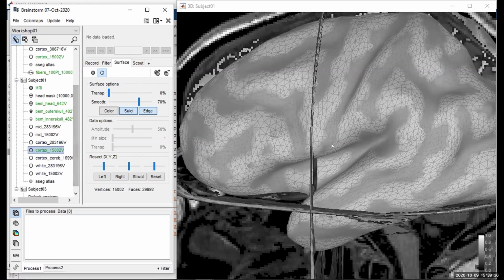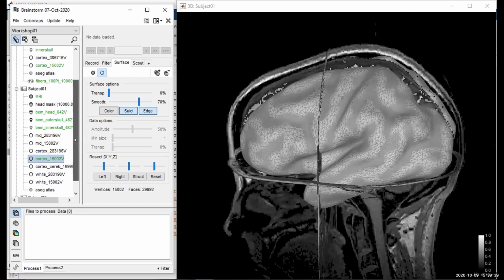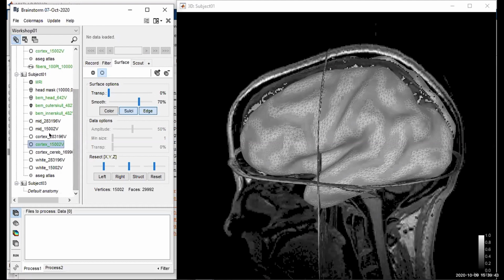I think this is a good overview of our different anatomy viewers as well as objects. I've mentioned fibers already. Maybe I can move on to functional data if there aren't any burning questions.